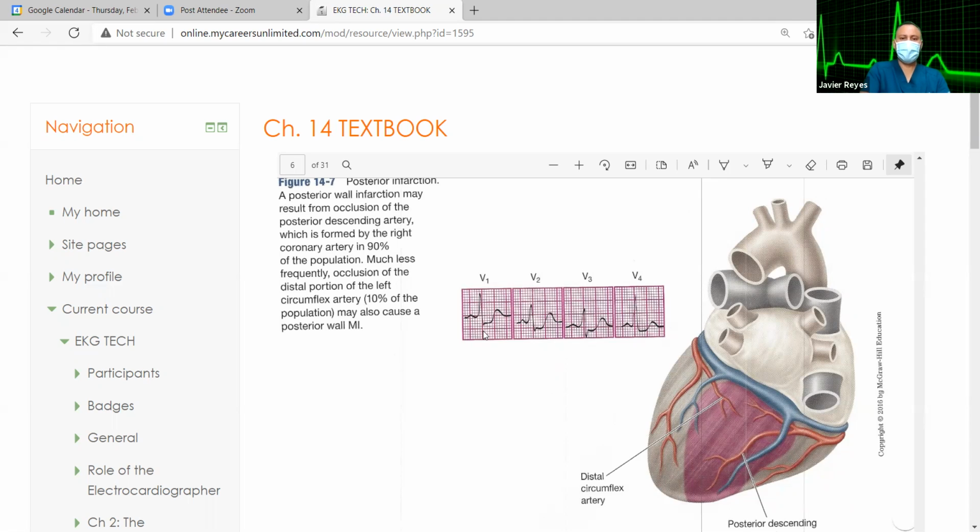So, Raquel, ready? V1? You have a P wave, and then the R, and then your little S. So it stops there, but it stays down there. What do you call that? It's not elevation, it's inversion. Nope. When you're down. Down. Depression. When the ST segment stays below the isoelectric line, it's called depression. ST depression. And then you have your T wave, right? What about V2, Jane?